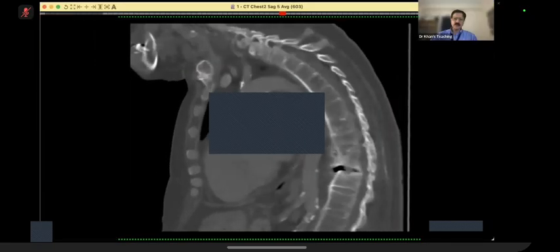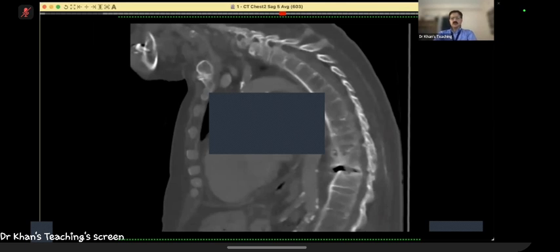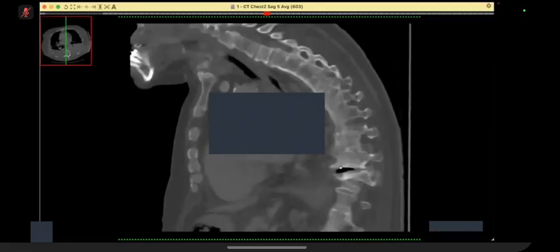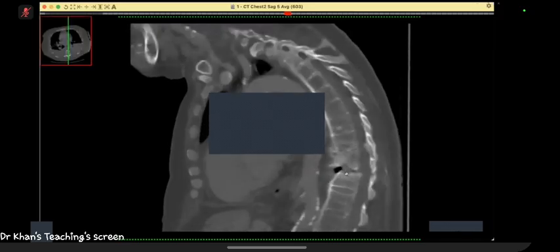Okay, I have now given you a sagittal. In the sagittal section, I can see that there is diffuse calcification of the anterior longitudinal ligament of the spine with fusion of the dorsal vertebrae. Along with that, I can see that there is vacuum phenomena within one of the lower dorsal vertebrae. You can move the mouse if you want. You can scroll through. Please continue. You were talking about the vacuum phenomenon. I can see that there is vacuum phenomena within one of the intervertebral discs.